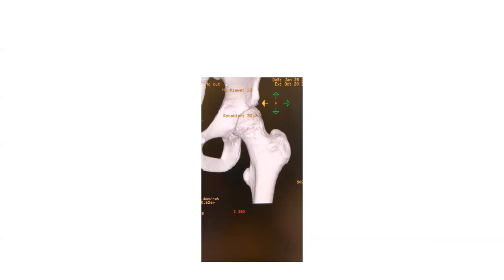You want to try to use that surrogate information to guide you. If this patient had some air showing up in the soft tissues here, what might that imply that you would have seen on the patient? Open fracture, okay? So this introduces another concept. You ever heard of the term compound fracture? Yeah, forget that term, it doesn't exist anymore. The term is open or closed fracture, and it just means that the fracture is open to the environment.